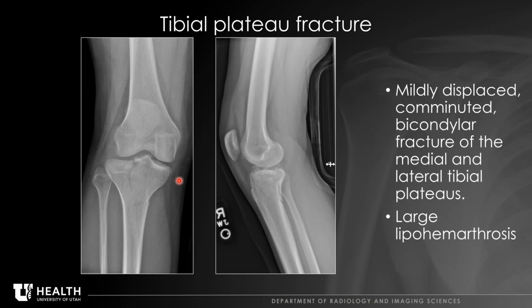And then here we have a tibial plateau fracture, and this has multiple classification systems that basically describe fracture planes. So here we've got this transverse or longitudinal fracture here. Here it's intraarticular coming here. We see this lipohemarthrosis with the fat, and then the blood and fluid right here. So the three layers here, 1, 2, 3, lipohemarthrosis. So that's a tibial plateau fracture.